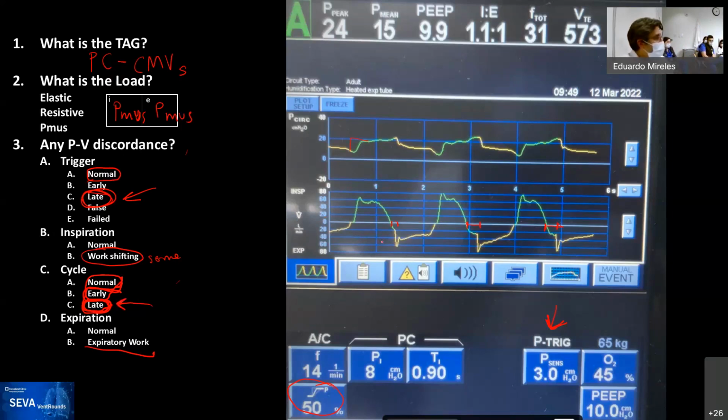But you said it looks like the patient is forcefully exhaling during inspiration, right? In other ventilators, you will not see the flow actually cross down. It will kind of plateau. That's the classic image that you have for a late cycle. In this ventilator and others, it allows the patient to exhale, and so all of this flow is now being exhaled, right?